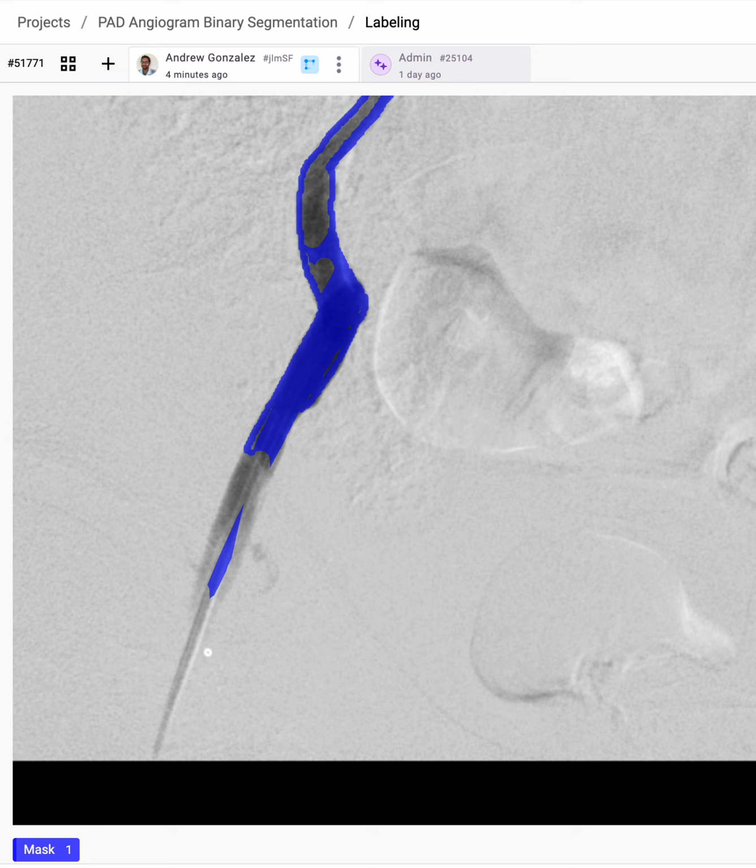Personally, I have not been labeling the catheter unless that part has refluxed. In this particular case, you kind of know the trajectory of the catheter. Well, actually, you don't know because this is femoral head here. So you don't know if this part of the catheter that obviously has contrast going through it is actually intraluminal or if it's just paralumenal and it's superimposed on top. So I would only label the part that you could see that's kind of clearly blood vessel.